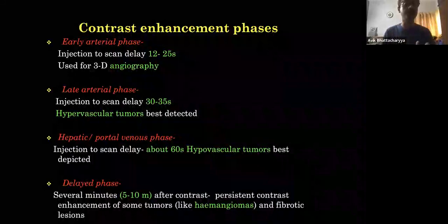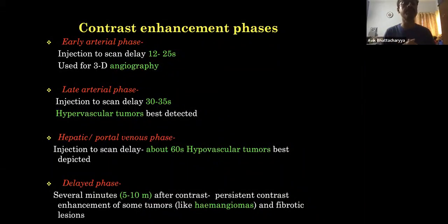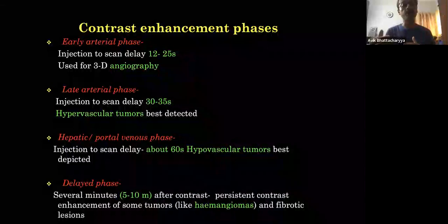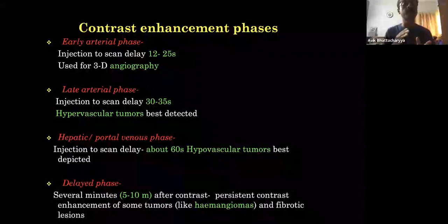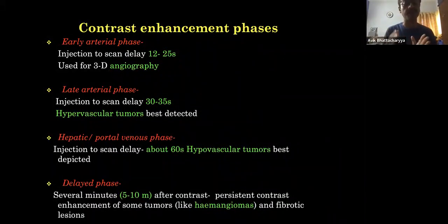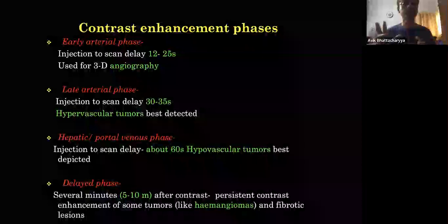I will show you all the pictures just to discuss the technical details, and then I'll take you to the normal scan, how we interpret a scan, and what the structures are. I'll tell you everything. And then after the portal venous phase, which I said comes around 45 to 50 seconds, the hepatic venous phase comes around 60 to 70 seconds. So all these things, as I have told, we have customized those seconds, all these phases, according to our need, our priority. So there is no hard and fast rule about which phases we'll be doing in which study.